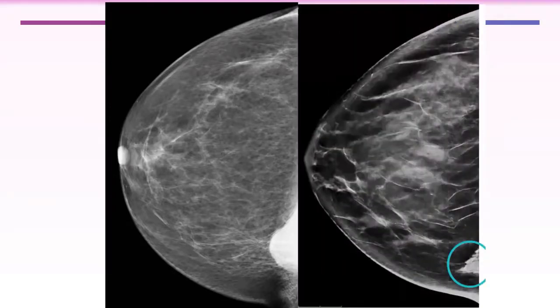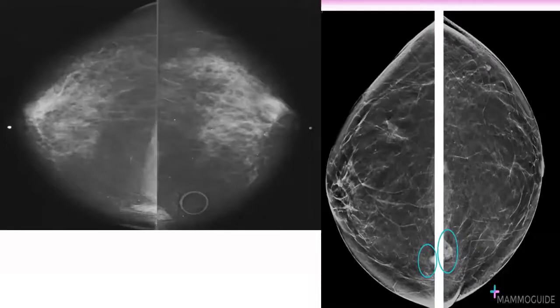Okay, and what about this? This is more typical of sternalis muscle because of the flame shape appearance. And these are two examples of sternalis muscle as a variant. When it is seen bilaterally, it is easier, but in unilateral appearance it will sometimes be a dilemma. But if we are aware that there is a variant in this area, at least we will include it in the differential diagnosis and search for it.